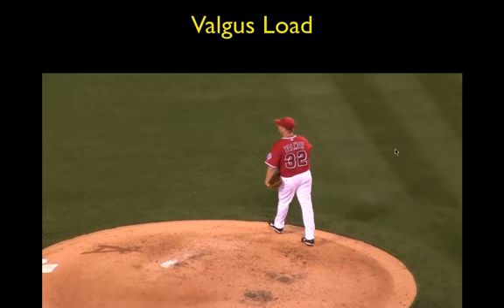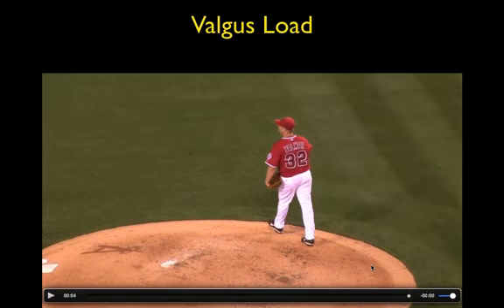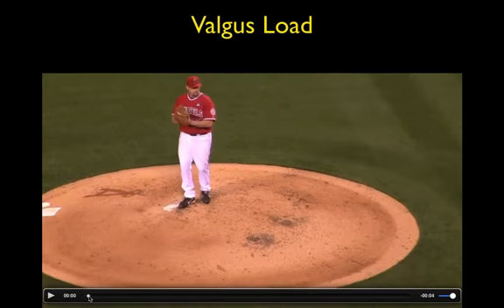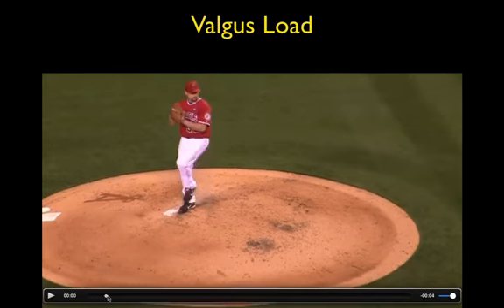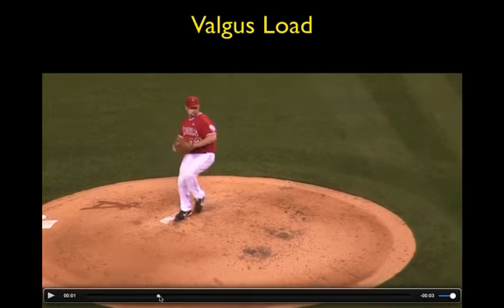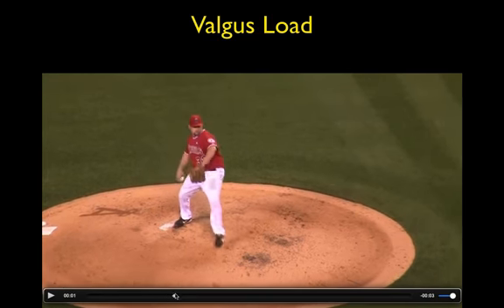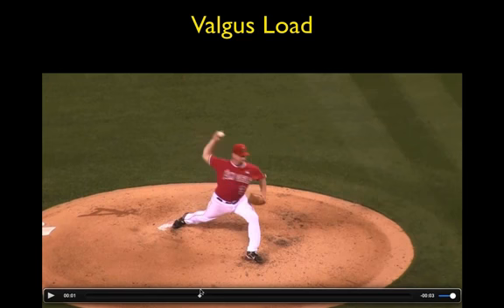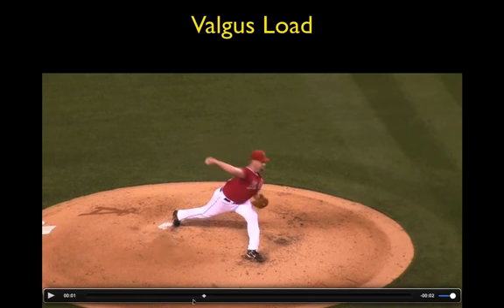So there we can see it. And if we start back here, you can go through the different phases. The hands are together here, so that's a windup. They're separated at that point. Then you get the early cocking phase there, and then the late cocking phase in this location.